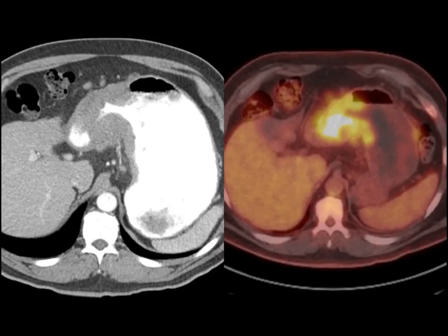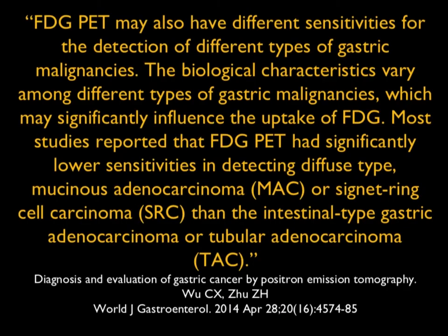I showed you this case at the beginning of the talk, and here you can see the positive PET correlation. We talk about different sensitivities in tumors depending on the pathology. Again, adenocarcinoma can be somewhat challenging depending on the type of adenocarcinoma it is.